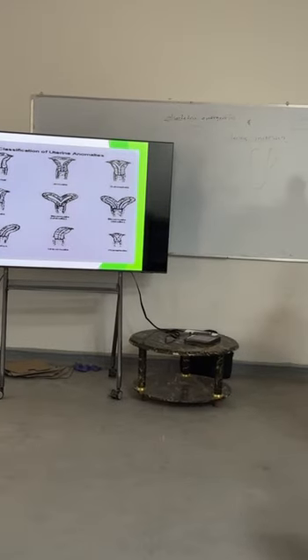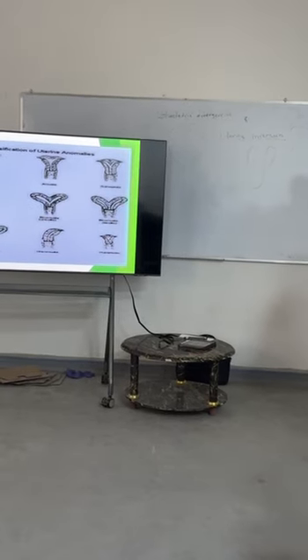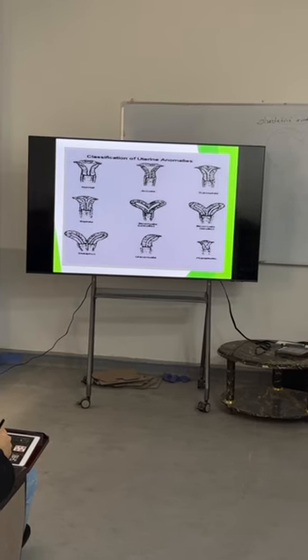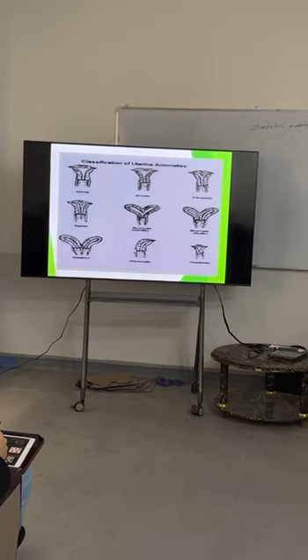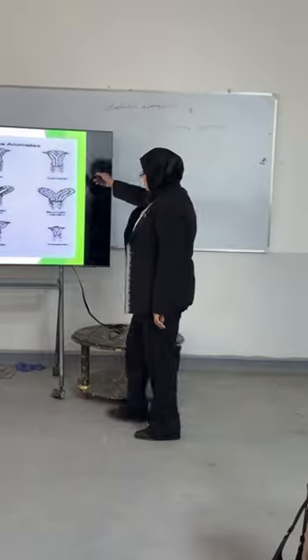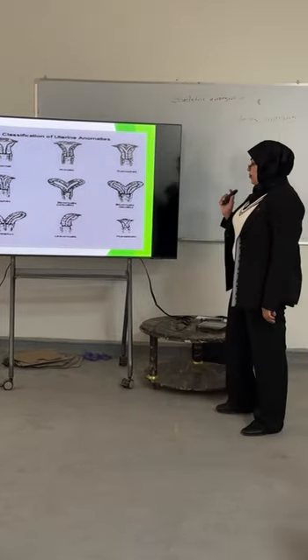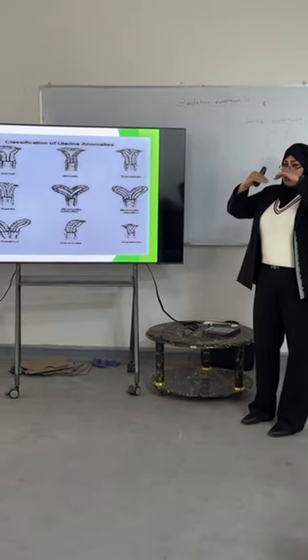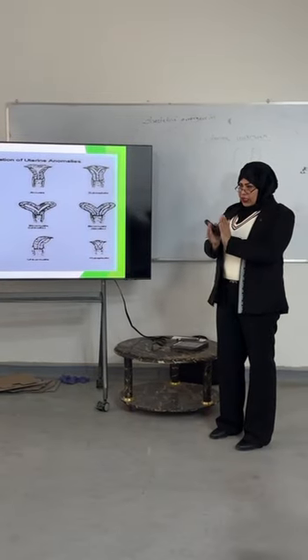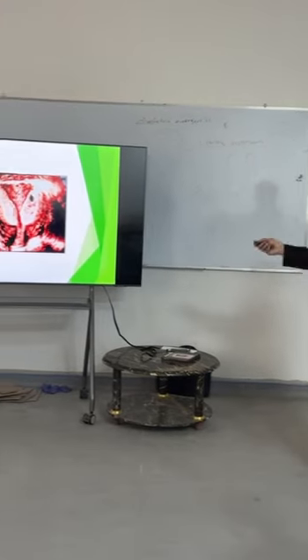Yes. The two important anomalies are the septated one and the bicornuate one. How can we differentiate between them? Simply, we can see the dome of the uterus. If it is intact, convex, with a line descending downward like this, it is a septated uterus. But if the dome of the uterus takes a concave shape from outside with this curve, it is a bicornuate uterus. And now, what's this?